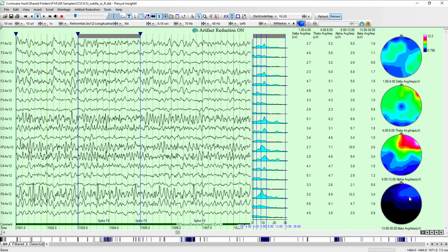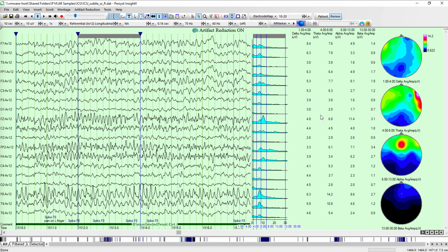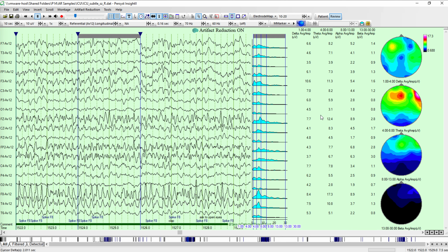that, you can see the beta display drops out a little more quickly. So the average is probably going to show a little bit, the numbers are going to agree more with what you're looking at on the screen, just as visual estimation. But those are the two options you have for representing those values. That is a quick tour through the frequency mapping. Hope it's helpful. I'm always happy to connect to answer any questions or to step through any examples and to configure this on your system.